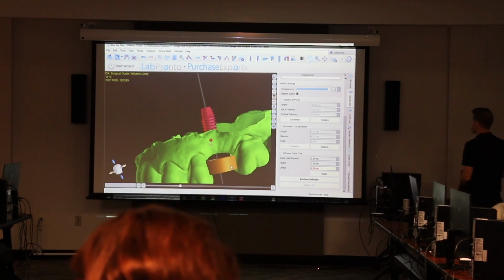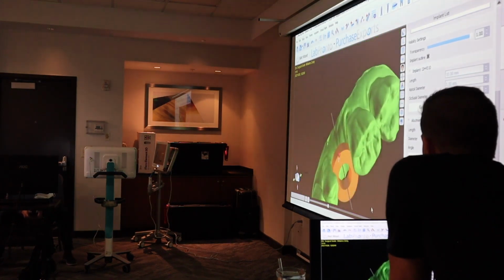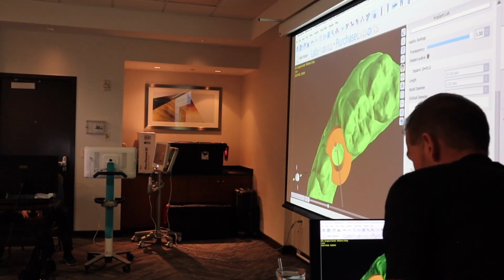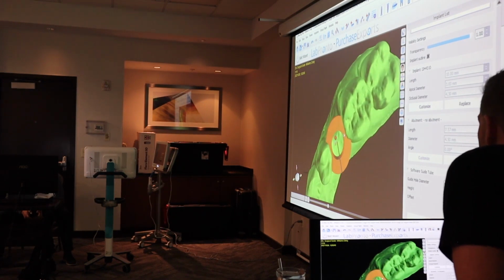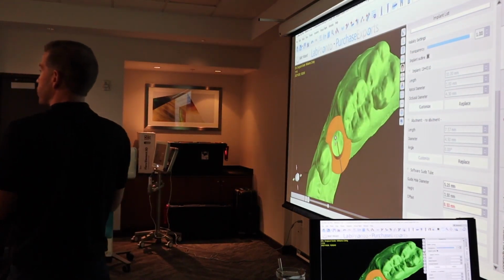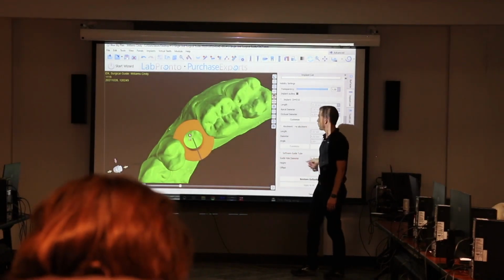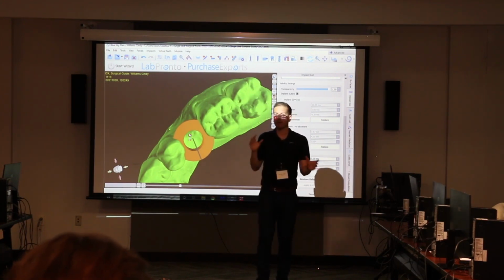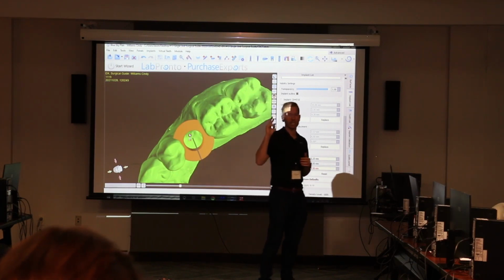Now, we've also got to shrink the diameter of the guide tube because I don't want to use a metal sleeve in this case. So on my printer, at my house, or at my practice, it's 0.25. And what that did was, that made this 5.25. I know that works for my printer. Again, the first couple times you do this, remember what we're going to do? We're going to do 3 guides. We're going to do like 5.1, 5.2, 5.3. Pick which one works best for you, and then stick with that number. That's how you calibrate your number.